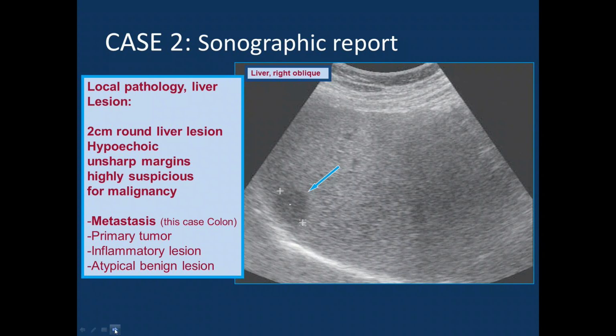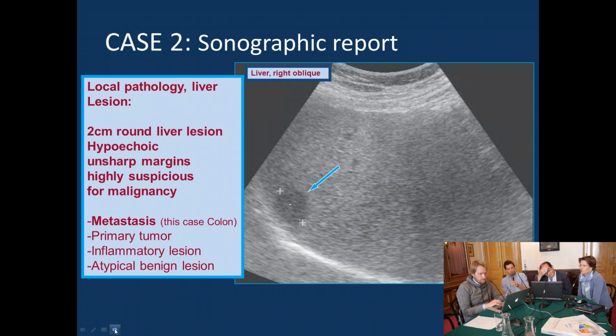Martina, could you explain the hemangiomas? They can be poorly echogenic. Well, echogenicity is always related to the surrounding structures. So if you say you have a hyperechoic lesion in the liver, then it's related to the surrounding liver parenchyma. But if you have a severe diffuse disease of the liver, like severe steatosis, then you can see a hemangioma which is hypoechoic, because it's always in relation to the surrounding structures.